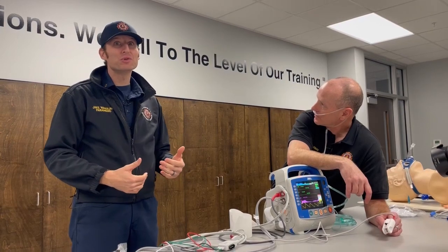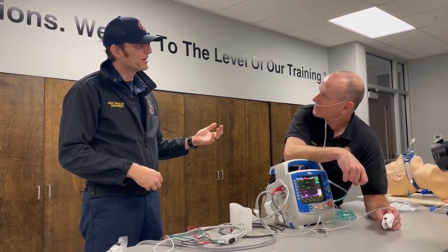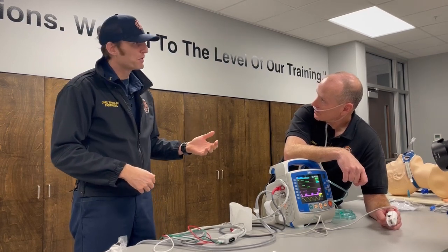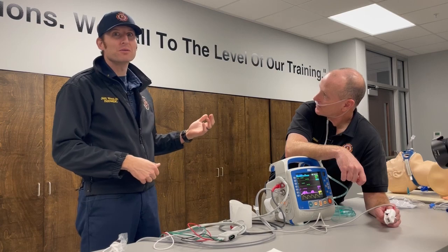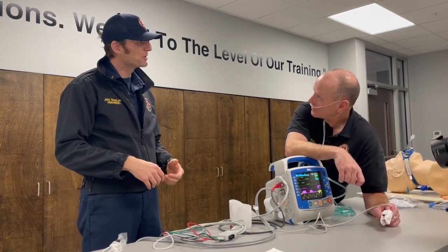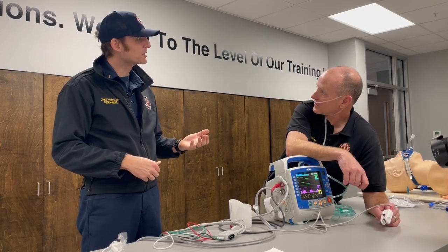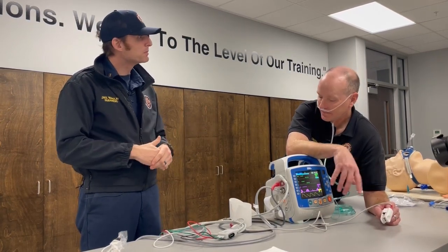Remember, if we're doing airway management, we want that number. It confirms where we are. But double check everything. Breath sounds, gastric sounds. If you have to, we have the capability with the laryngoscope, with the new devices, video scopes, you can have McGrath, to actually displace and look, is it in the cords? Correct. It could be the device, meaning the end tidal, that you need to swap. Yep. It could be.